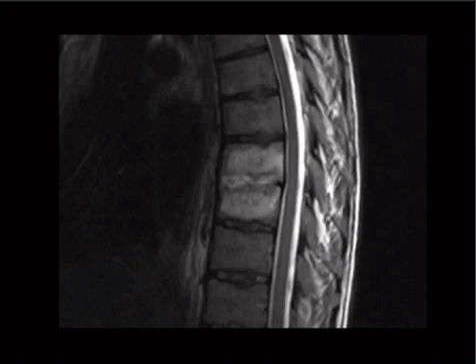Now the follow-up question would be, where does osteomyelitis start? So I don't want you to get confused because I told you, like, look at the disc, look at the disc, look at the disc. You see the disc, then you see adjacent end plates, you call it infection if you're forced to choose. But it does not start in the disc. This is an important thing. It actually starts here at the end plate, and then it crosses into the disc, involves the disc, and then breaks through, involves the adjacent end plate. So that's the order that it goes through, and it's like a hematogenous spread.